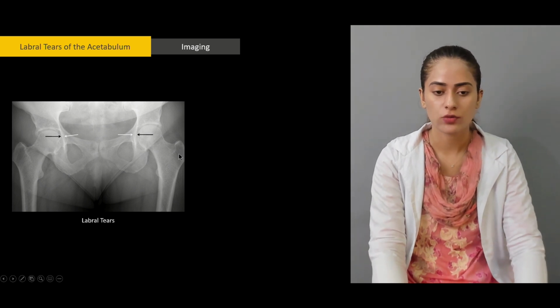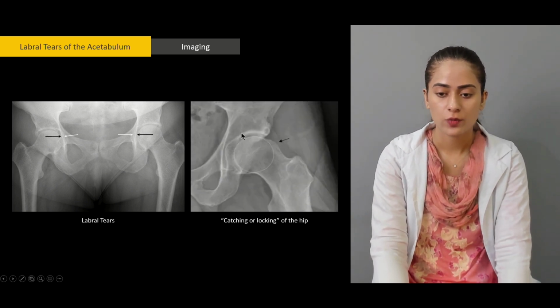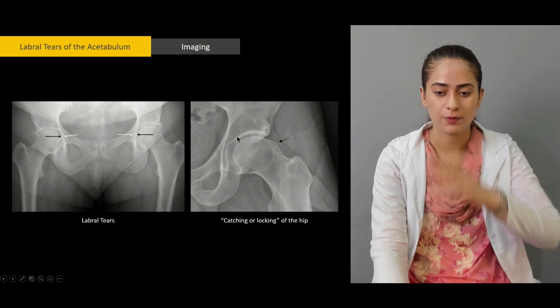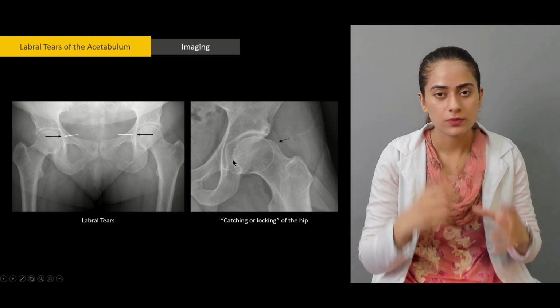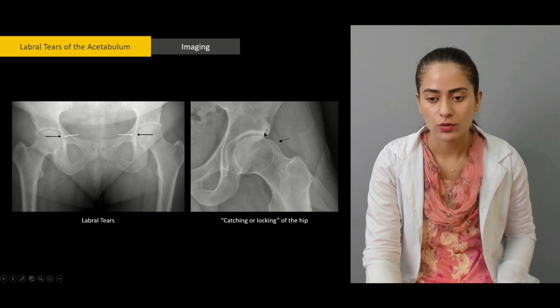We suspect some labral issue here as well. We can suspect this double lining here, because this is not the same as here, right? There is this protrusion that signals that there is something wrong with the labrum. And then also here, there are changes here.